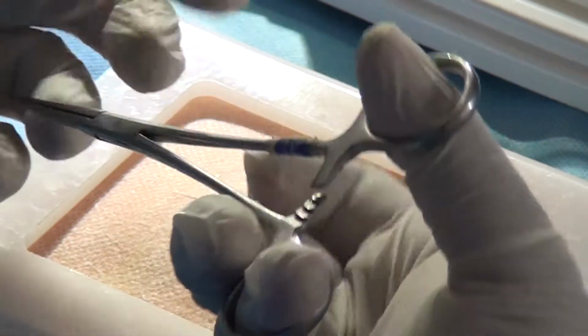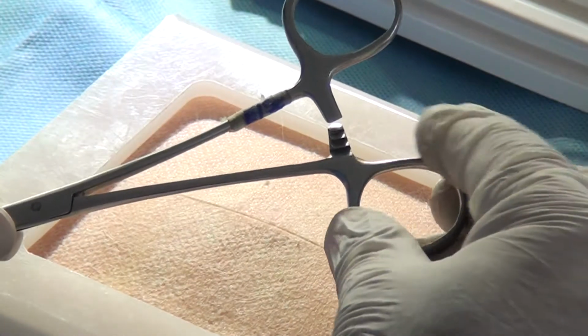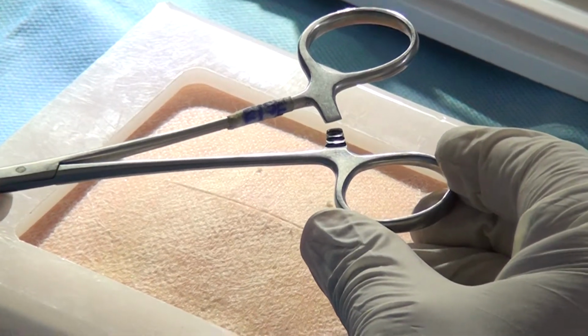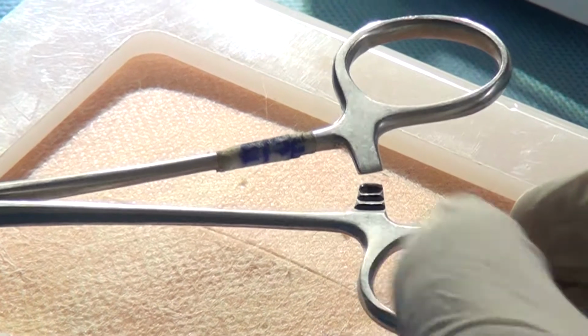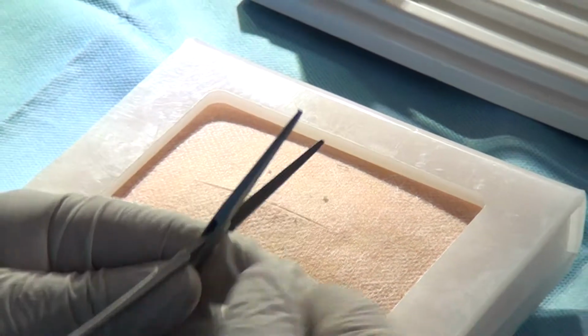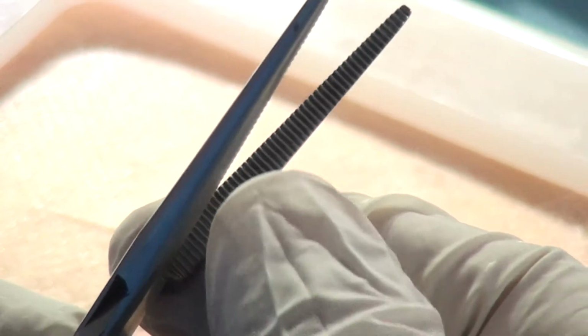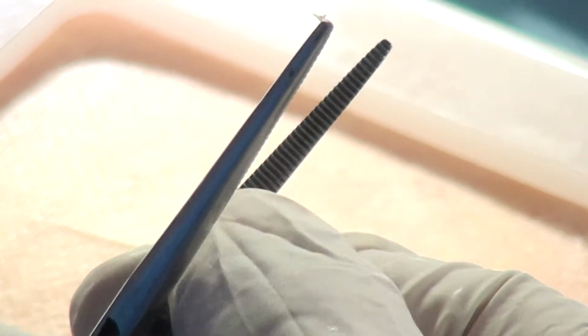Look at the instrument on the screen. There are ratchets at the back, about three of them, and you can see them very clearly. There are two rings, and the ratchet at the back. There is a shaft. Then you can open it up and see there are serrations. Zoom here, please. The serrations are transverse. Can you see that? Let's start with one thing at a time.